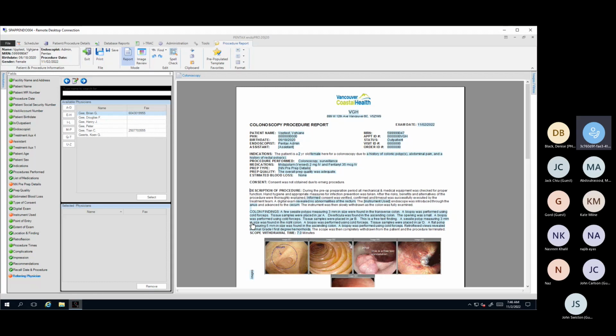So I just wanted to go back to the editing again on the blue space. I know that we do have a concern, particularly in gender, but you see how female in this case is blue. These are things that link back to Cerner. So if you do impact them, it may not accept. We could run into problems where it's not accepting the report, and then we're trying to figure out why it's not taking it. So just be careful if you are editing the white space, that you definitely don't edit the blue, just because there's direct linkage with it.